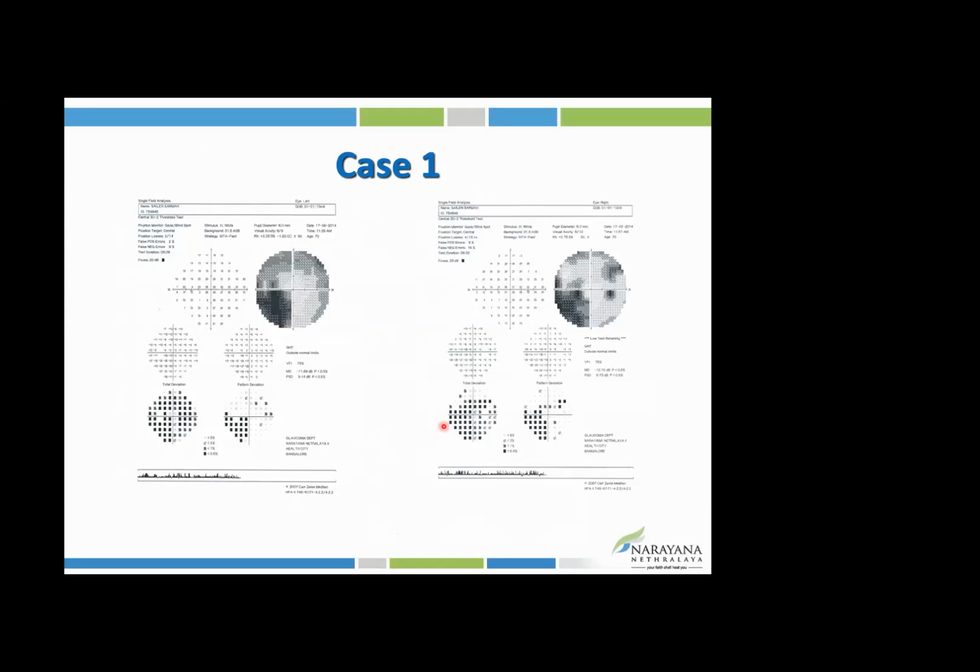Respecting the vertical meridian, the classical pattern is quadrant anopia. So basically we have a left inferior quadrant anopia, that's pie in the floor. And when you have a lesion like this, which is the pie in the floor, we have to think of the opposite. So right parietal lobe lesion.